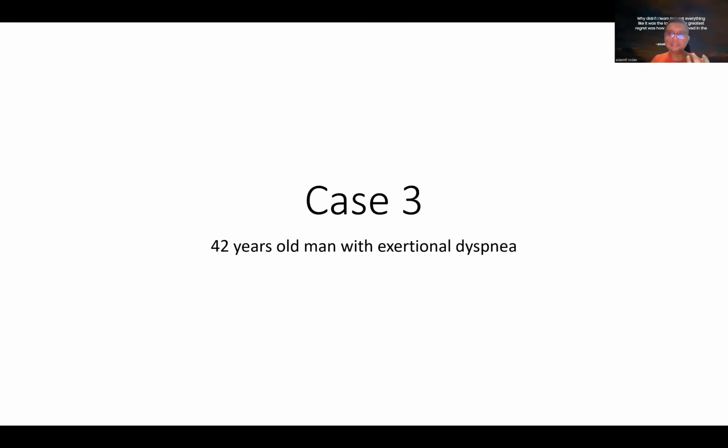So that is my second case today. Just to recap, our first case is someone with severe AR due to the fused leaflet of the bicuspid valve and infective endocarditis that might be missed during the first intra-op operation. Our second case is a pregnant lady with mechanical aortic valve that is also dehisced, but this is an early surgical failure. And I've shown you how to assess severity of aortic regurgitation in both of these cases. Now let's go to our case number 3.